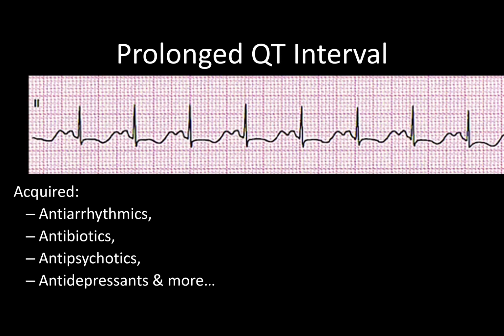As part of the advanced arrhythmia, I'm going to bring it back around to the prolonged QT interval because it's really important when we talk about ventricular rhythms. And here's why. So prolonged QT interval can come about 2 different ways. You can have long QT syndrome, and that's inherited, and that's when certain drugs or medications will just rapidly put you into a prolonged QT state. More often what we would see is the acquired type, which is what tends to come through hospitals.